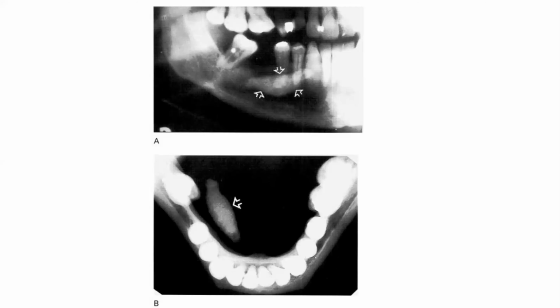Here we have a salivary gland calculi. Submandibular gland calculi are often radiopaque, and they develop within the main duct or in the gland itself. Those in the main duct are often superimposed on the outer bone, producing an opacity apparent within the bone. Stones in the gland present usually below the lower border of the mandible. We can see the salivary calculi from two different angles on this X-ray.